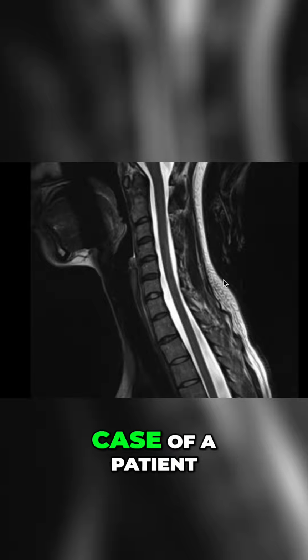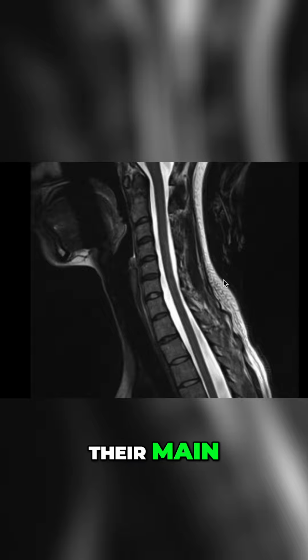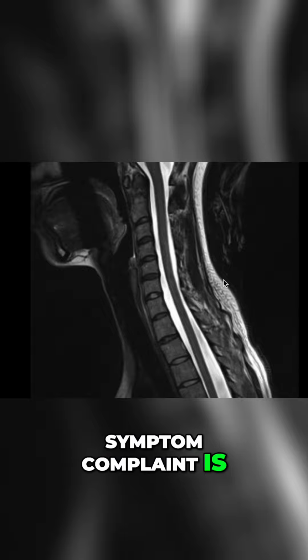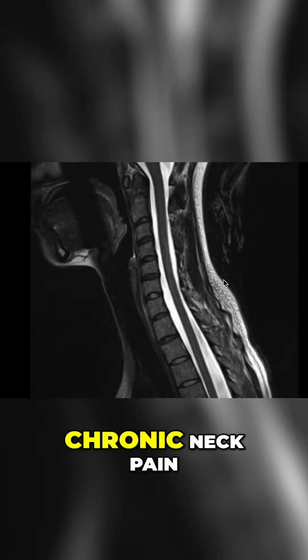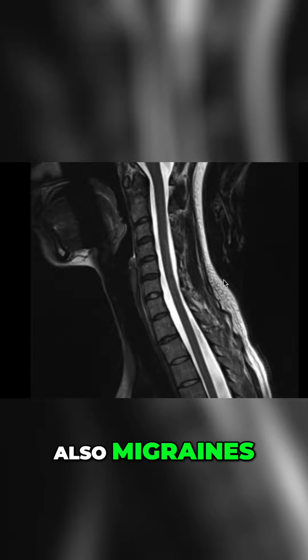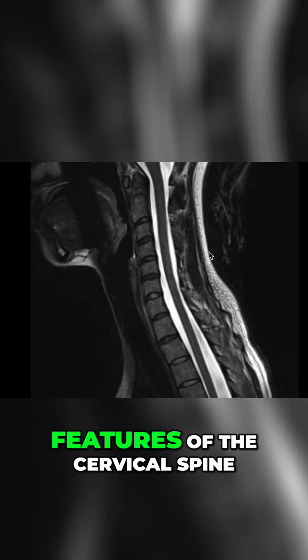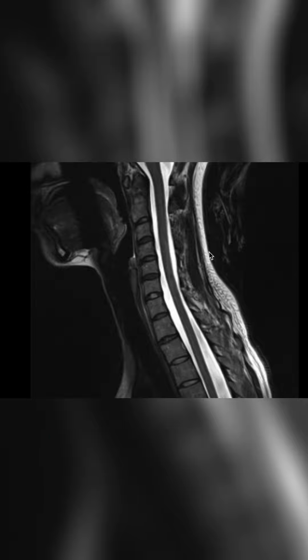This is an interesting case of a patient that I have that has Ehlers-Danlos syndrome. Their main symptom complaint is chronic neck pain, but there's also a history of headaches and also migraines. I wanted to do this video to demonstrate some of the interesting features of the cervical spine.